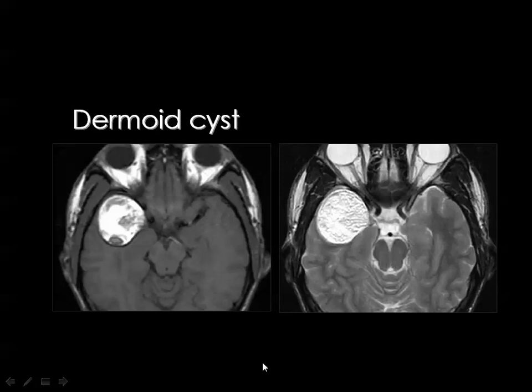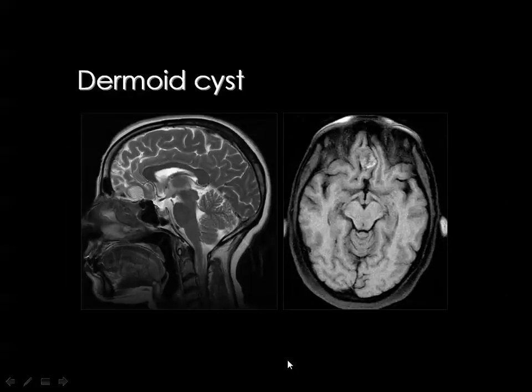Whenever you are diagnosing an intracranial dermoid cyst, you should look in the ventricles and the subarachnoid CSF spaces for fat globules. This is T1 and T2 weighted images of a dermoid cyst, not in a typical location, but you can see the fat within the cyst and other soft tissue structures. You know that the sensitivity of MRI for detection of calcium is less than that of CT, and that's why you can see fat very clearly by MRI, but you cannot see calcium in most cases.